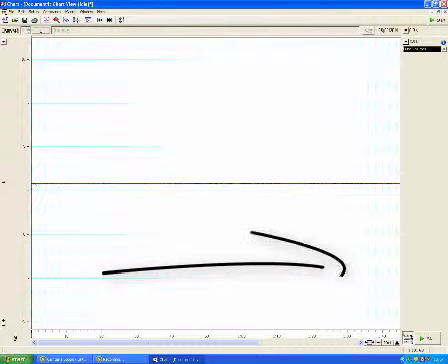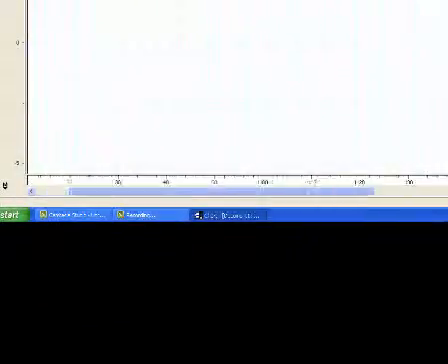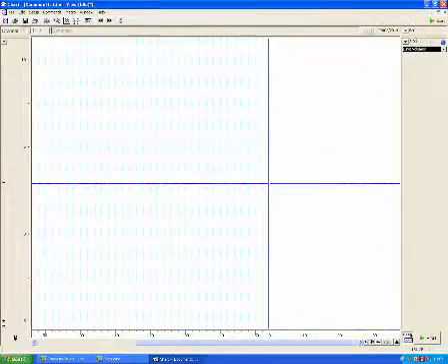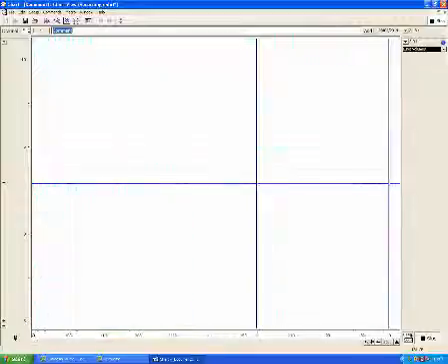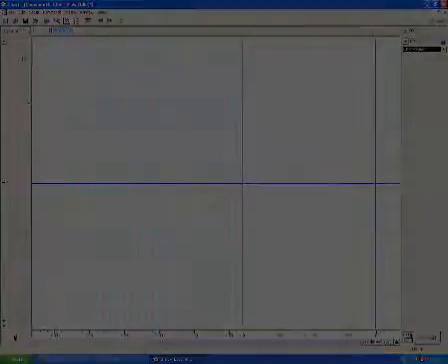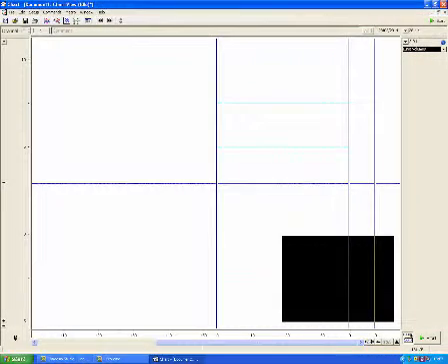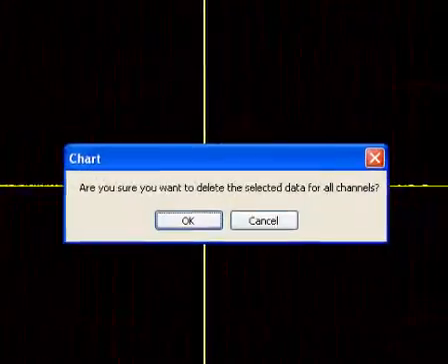The horizontal scale measures the speed at which the trace records. The speed of the tracer can be set so you can determine the relationship between speed and time. To look through your recorded data set, use the scroll bar at the bottom of the chart. When a blue vertical line is present, this indicates that the trace has been stopped. You can pause your recording at any time to reset the chart. If there is unwanted data, simply click and highlight the data you do not require. Once highlighted, press Delete to remove it permanently.